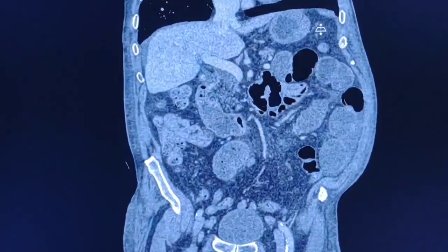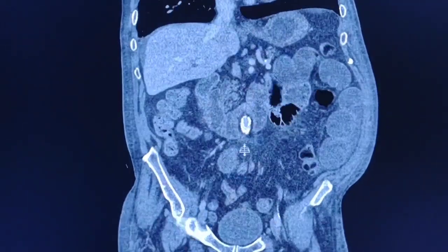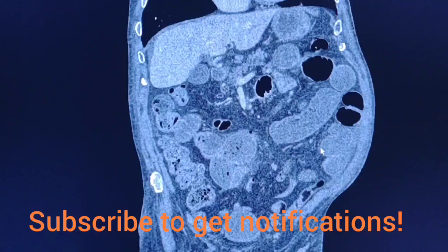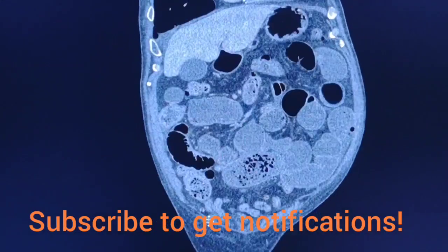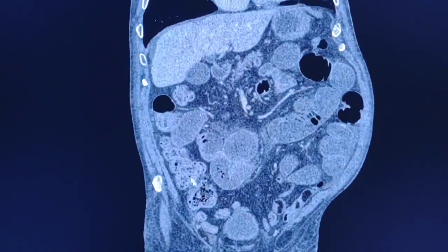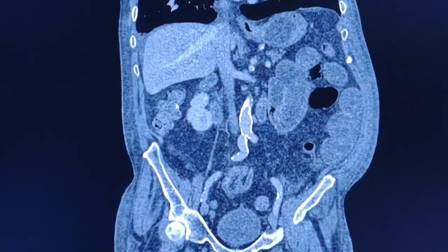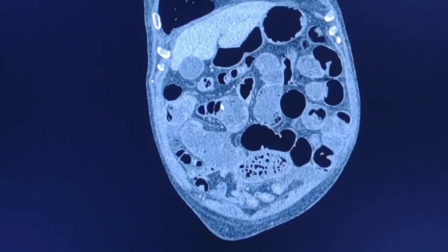It's very important to see the whole bowel, the small and the large bowel, and to determine the site of the obstruction. As we can see, the large bowel, which starts here, just follow my arrow here. There is no dilatation of the large bowel.